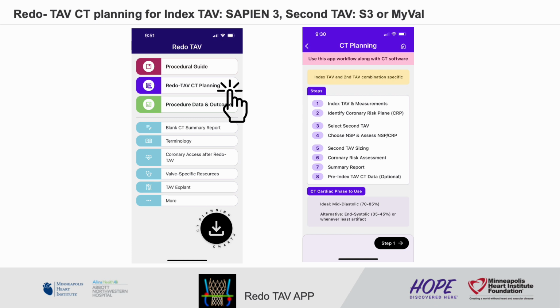you need to do. The CT acquisition protocol can be the same as routine pre-TAV assessment. It's recommended to obtain ECG-gated multi-phasic functional CT that covers the entire cardiac cycle, with ideally 20 phases, a minimum of 10 phases. The mid-diastolic phase generally has fewer artifacts, allowing for better assessment of the prosthesis frame and commissure alignment in most patients. The end-systolic or end-diastolic phases could be used as alternatives.